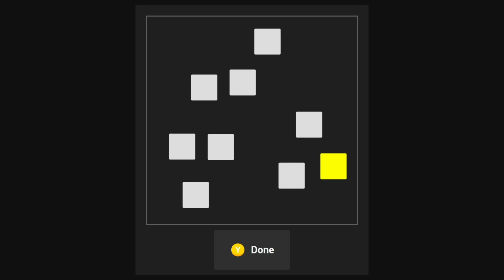So in this test, it's about short-term memory, and you have two strikes. So let's say I press just this one and Y again, then we are done.